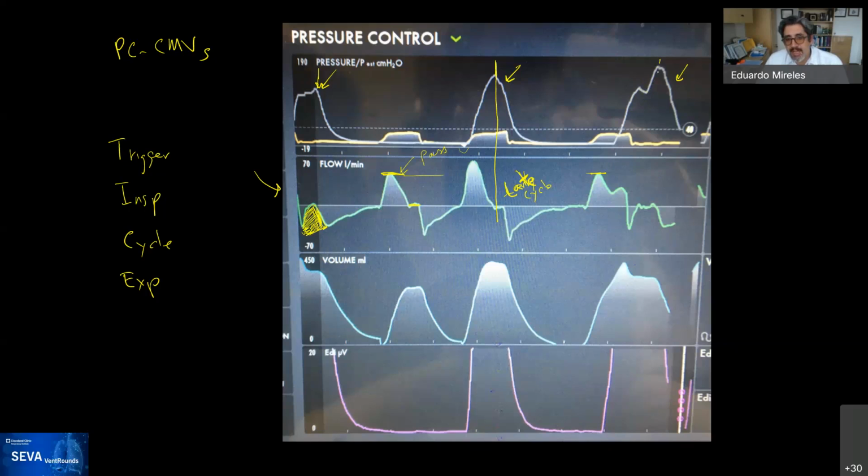Then it finishes and cycles all the way over here, and the patient exhales. So this is a nice example of early trigger, late cycle, and inspiratory work, or a missed trigger right here for this patient, which should tell you how much the waveforms can tell you, but the EDI certainly adds another dimension.